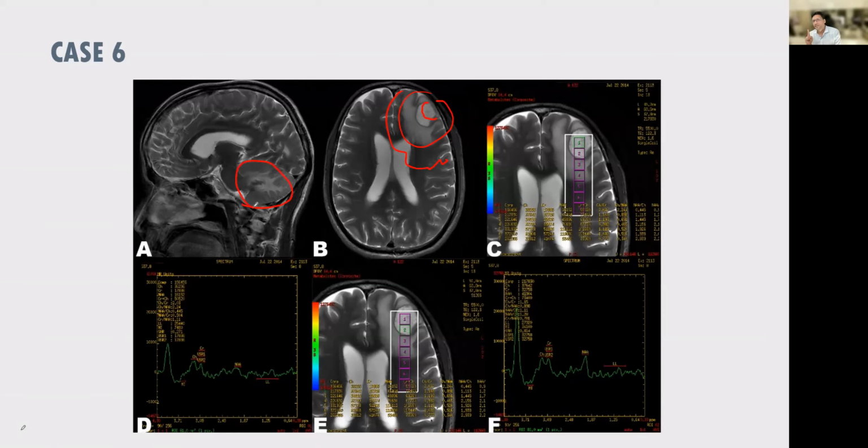So this is not a single lesion. What I have seen is abscesses, and definitely it's not an inflammatory lesion. Inflammatory tumefactive demyelination is out of the question because it's a very well-defined lesion and a large lesion. So we are left with an infective lesion versus a neoplastic lesion. So we have multiple lesions. Out of my experience, when there is a disproportionate edema, both can be possible.